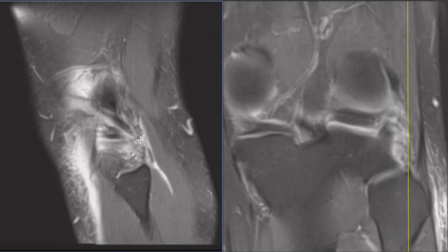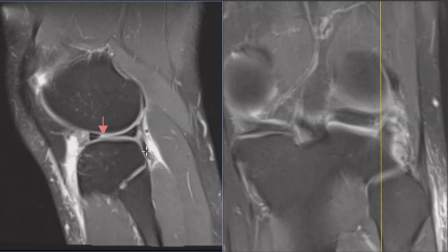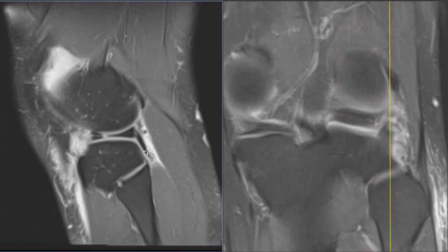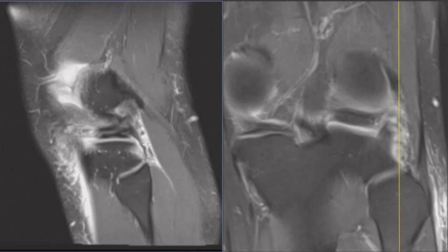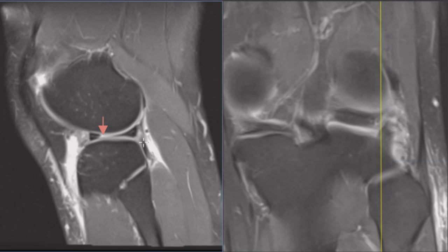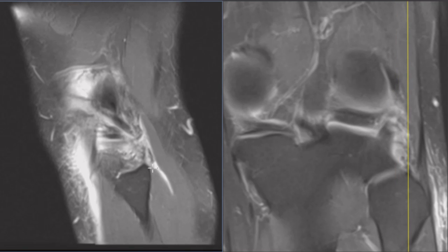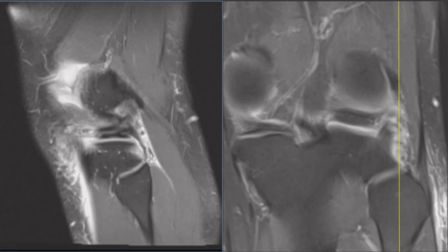Here's the popliteus tendon right here. Attaches to the femur up high, and it comes down obliquely, wraps around right here, and turns into the muscle back here. So the popliteus looks great, but there's something over that. It's called the popliteofibular ligament. So off the fibula, we have a little ligament that goes around the back of the popliteus, holds it in place, and it looks like that is torn. There's a little thing here, maybe part of the popliteofibular ligament that is torn.